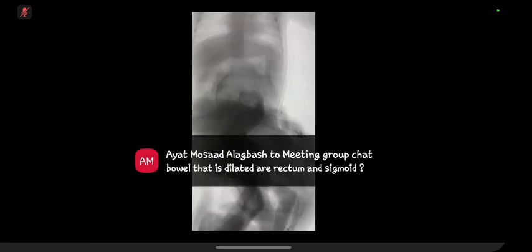That means that the patient cannot have the intussusception reduction. So that was done laparoscopically to remove it, it was about 9 centimeters of intussusceptum. So 9 centimeters is a long length to push, and keep a check on the pressure and the clock as well. And as I told you in the previous case, we cannot distend the rectum beyond a certain limit. It has limitations. Otherwise, it can cause perforation, and that would lead to another complication in the patient.